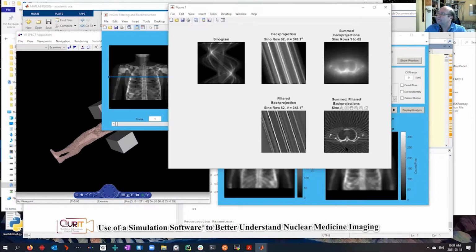So as we were saying in a previous class, if you do simple back projection, you're really oversampling the low frequencies. And therefore, the top right image gives you a very blurry image because you're emphasizing the low frequencies overly. Whereas the ramp filter tries to get it right and puts increasing emphasis on the higher frequencies. And through the projection slice theorem, you start to see why it works. And then you start to get the image at the bottom right.